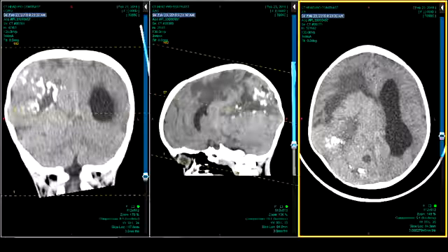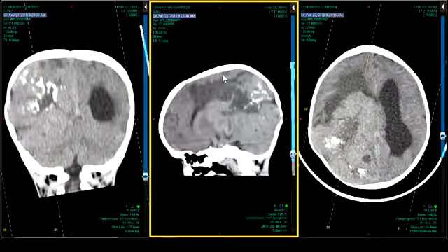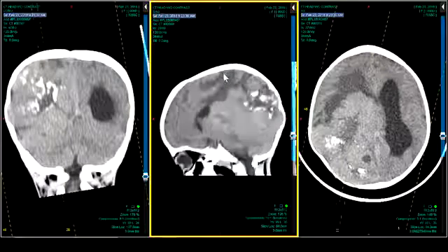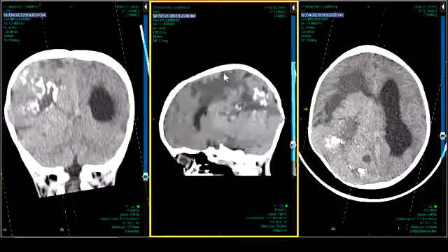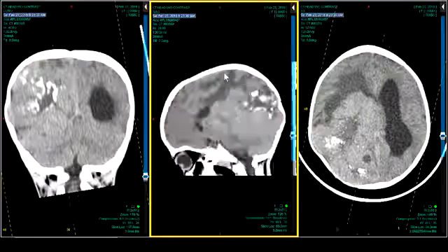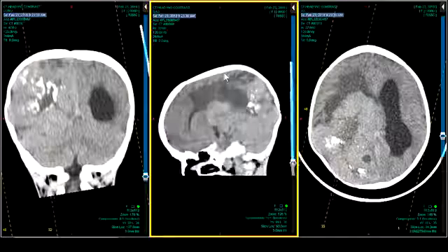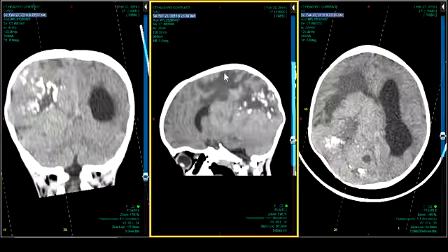All right, we have a follow-up MR, and I'm not sure that really adds a heck of a lot. It doesn't. All right. So how would you narrow the differential diagnosis? Pretty difficult, really, for the patient, but as far as the differential, it's very limited. So what things would you consider? Dr. Schupek, what things would you consider?